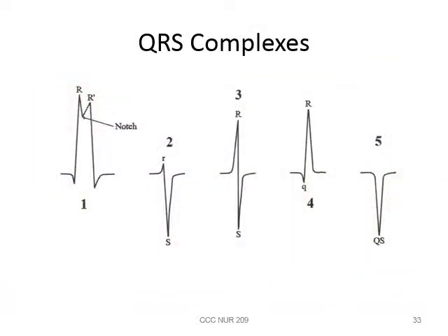Okay. Again, just another type of QRS complexes. As you learn more, as you dig deeper into this, especially those of you who love cardiac, these will mean different things to you. When you see the R prime, or what we call the bunny ears, or when you see a deep Q wave, those have significant meanings as far as cardiac rhythms. Not for you as the beginner.